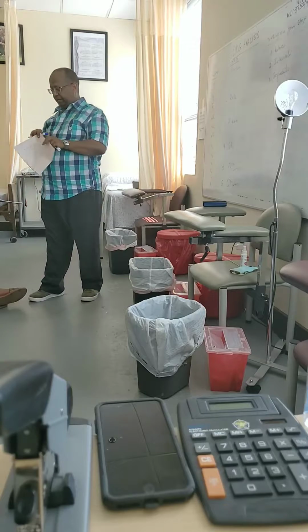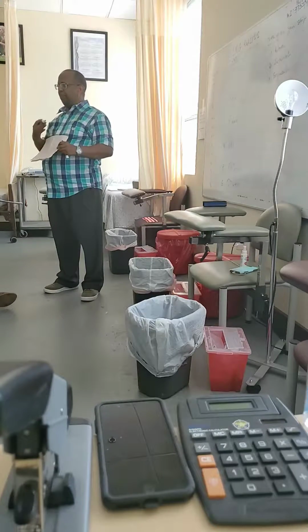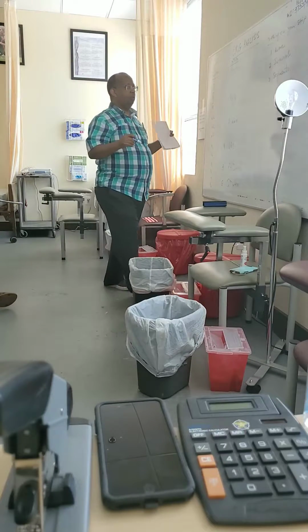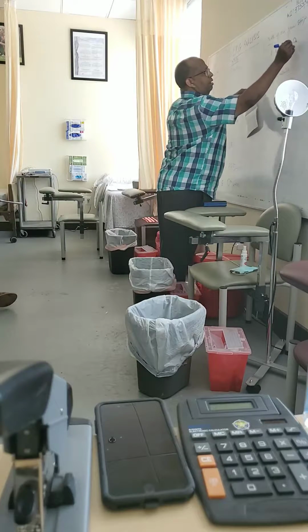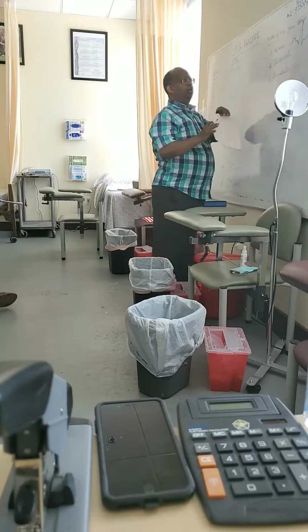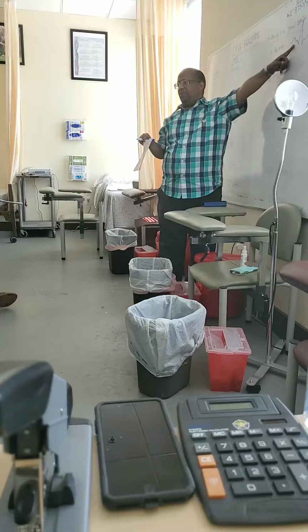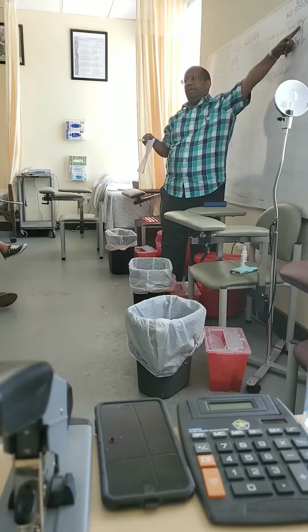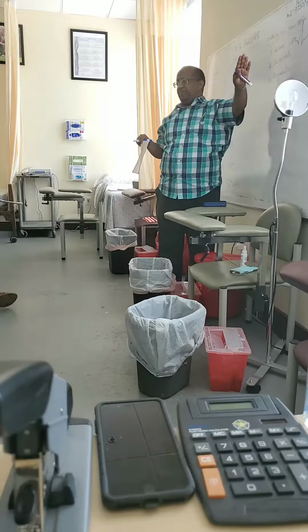Now let's see here. Can you see the waves? What do we mean by waves? They go up and down from the zero line. So on the waves, you have a zero line, and from the zero line, it goes either up or down. For example, is this going up or down? Up. This is going down. This one? Up. These are called waves.